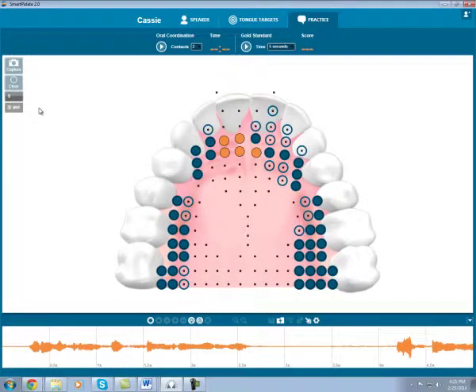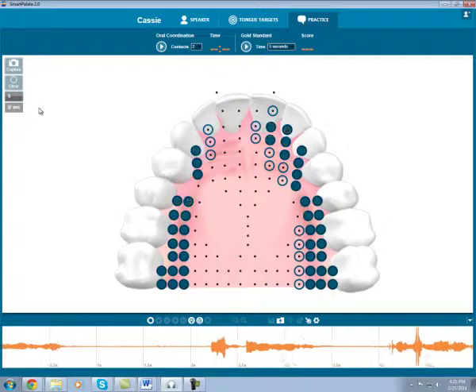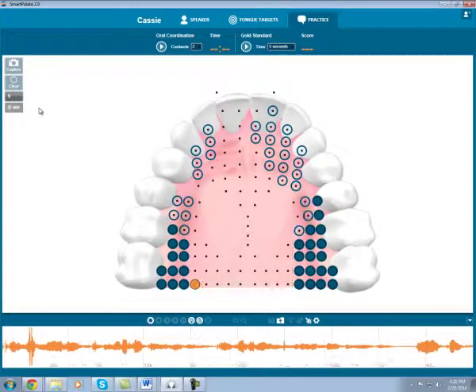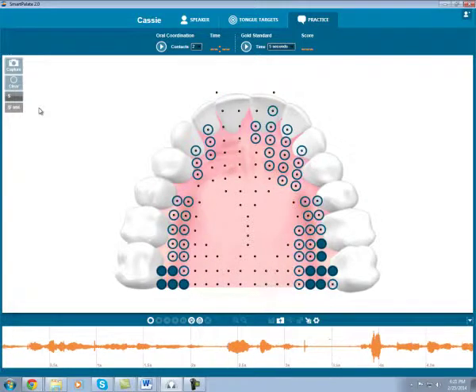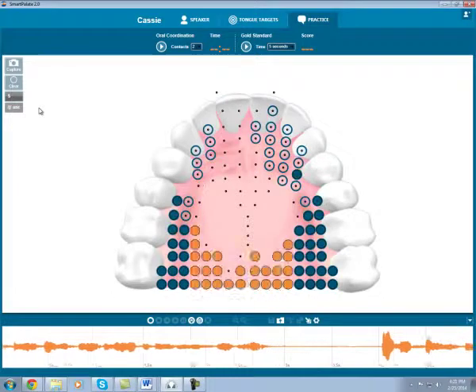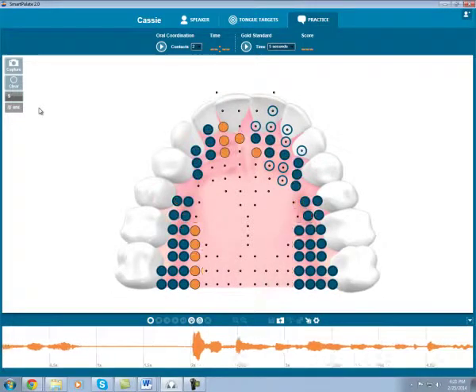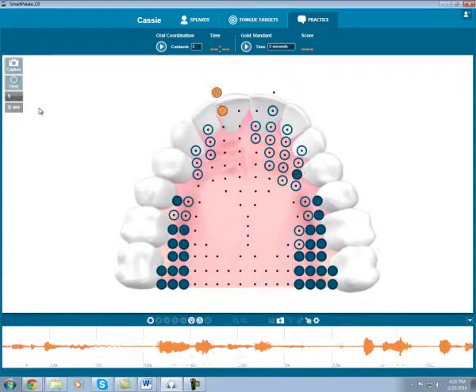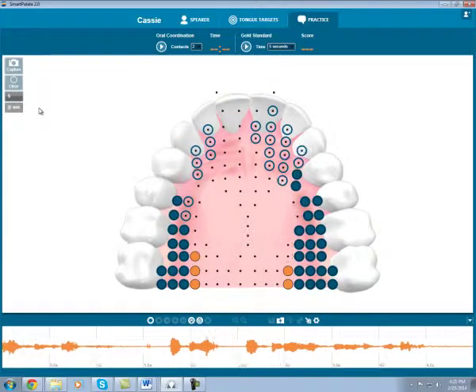The next thing that you'll notice is that my S is a little bit uneven. I'm heavier on one side than the other, and that's okay. It's actually important to note that many people are going to be slightly off. Every sound is going to vary from person to person, and even production to production. That's alright. That's the beauty of creating custom targets.